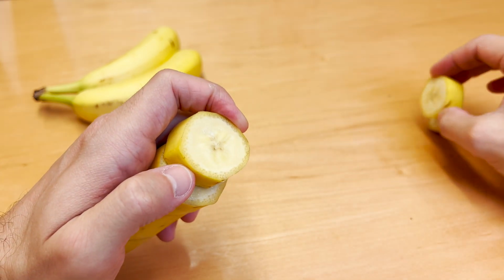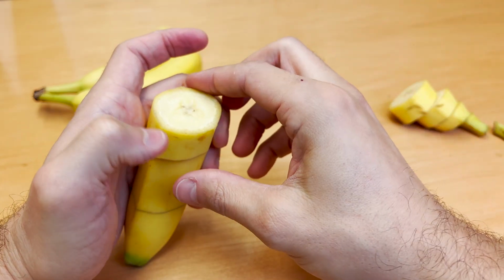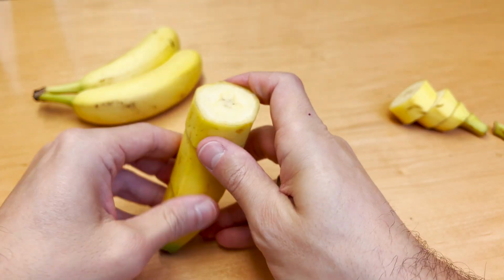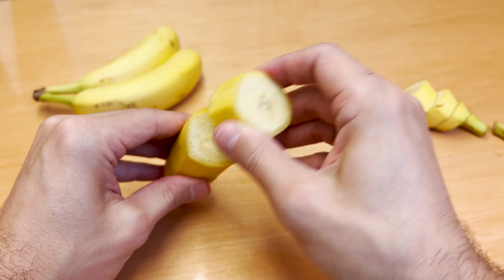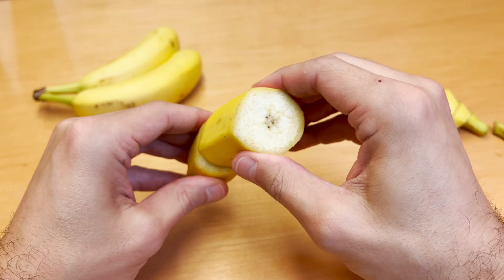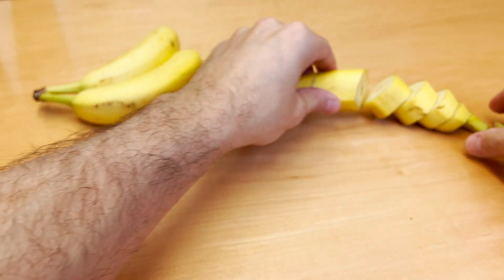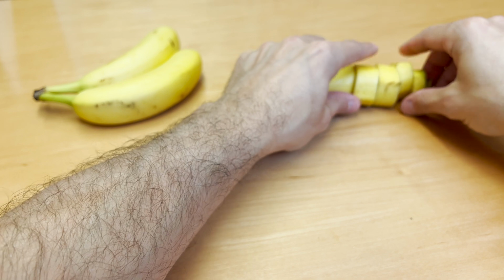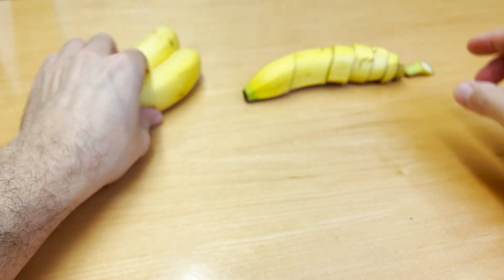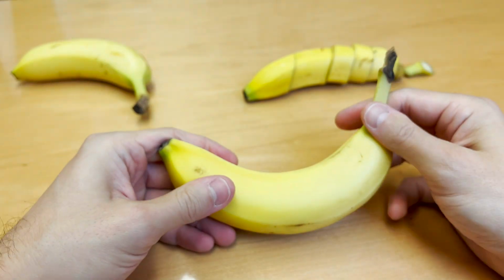And we just keep moving down. And once again, we're all pretty familiar with the shape of a banana, so it's pretty easy to see where we are. And as we move further down, you can see how that works, okay? So I'm going to leave this up here like that so y'all can see it. And then we're going to make a different cut through the banana here.